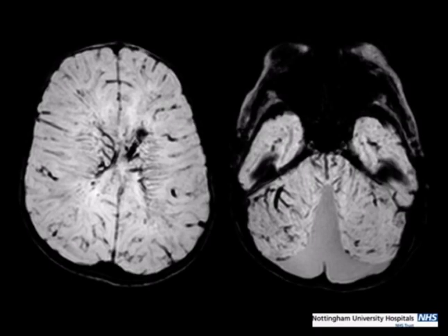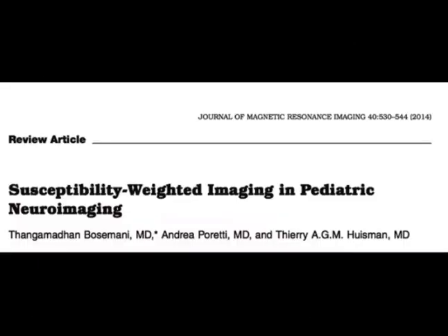This is the susceptibility-weighted imaging in this case, and if you're not used to it, it can look very odd. You do normally see an increased conspicuity of the veins on susceptibility-weighted imaging. These are really grossly pronounced, and what this is is all of the deoxyhemoglobin pooling in the veins within the brain, secondary to the hypoxic ischemic injury. I'm a big fan of SWI in lots of different pathological conditions. I think it really adds sensitivity. And if you're not used to it or haven't started using it yet, this is a really great review that I would direct you to. It's got a nice range of pathologies and explanations from the group at Johns Hopkins.